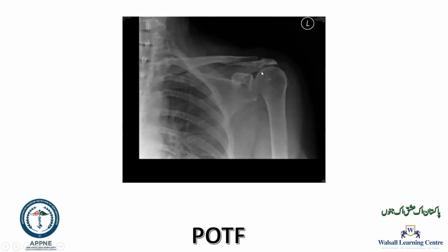So the second thing you see, although this is not dislocation, is that it's like a bulb. The reason for that is that the tuberosity here is touching the acromion every time because there is no supraspinatus to depress it. So it is smoothing it off. This is called auto decompression. So it has decompressed its tuberosity, and therefore it becomes a soft shoulder. And then it's saucerizing the acromion, i.e. touches the acromion, so it is impinging on the acromion also. These three signs will tell you that there is no cuff.